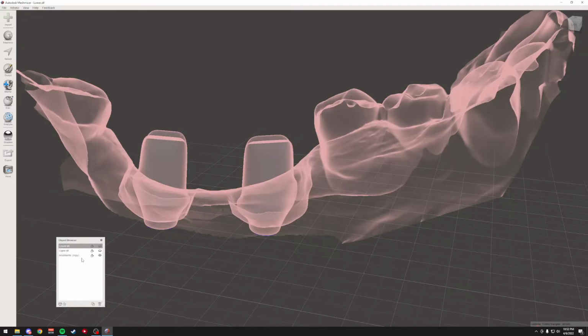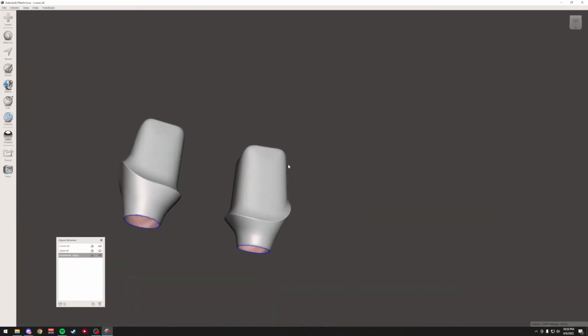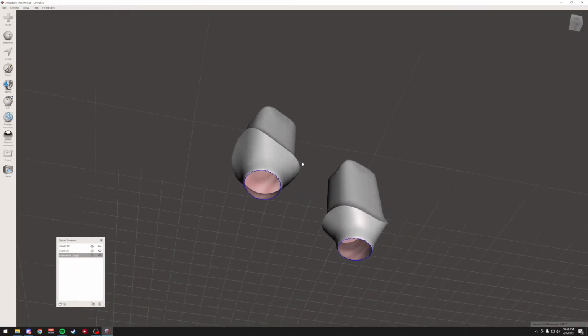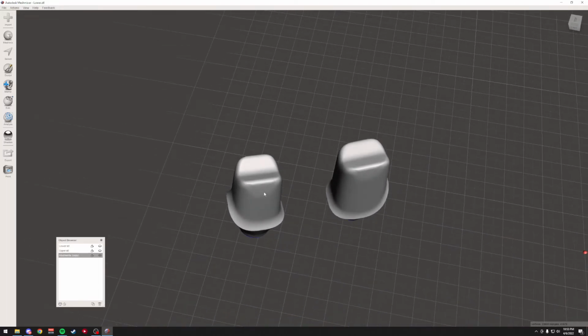Let's say you want to have a way to stain those crowns or something, or you wanted to have like a little dye pen. Let's say, for example, you've got a translucent crown material, and you wanted to anodize your abutment and see what that looked like, but you want to stain it and not get any of that stain on your abutment, for example.